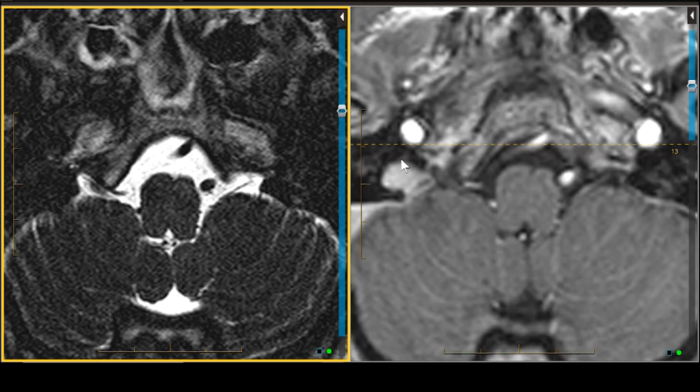And if you can see it on CT, it's beneath the styloid process and the muscles connected with it. So that's the lower border of the stylopharyngeus. It then curves forward, or anteriorly, we're not going to be able to see it here, forming an arch on the side of the neck lying directly upon the stylopharyngeus and middle pharyngeal constrictor muscles. That is the exit of the glossopharyngeal, or 9th cranial nerve.